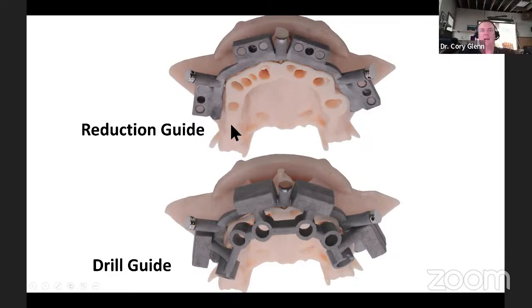How am I getting this model again? Because if you'll notice on this model, I've not only got accurate sockets where those teeth are extracted, but if you look right there, that's one of my implant sites. So how am I getting all of that? Well, you get the sockets from the blue sky segmentation, because it's all automatically subtracting out the tooth root spaces.